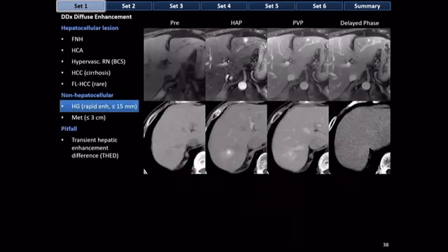Okay, now I mentioned that some things that are not hepatocellular can also diffusely hyperenhance. So small hemangiomas can hyperenhance. These are sometimes known as flash fill hemangiomas or rapidly enhancing hemangiomas. 2 different hemangiomas, 2 different patients, top row MRI, bottom row CT. Notice that in the arterial phase, these 2 hemangiomas look very, very similar. They're very small, enhancing light bulbs.